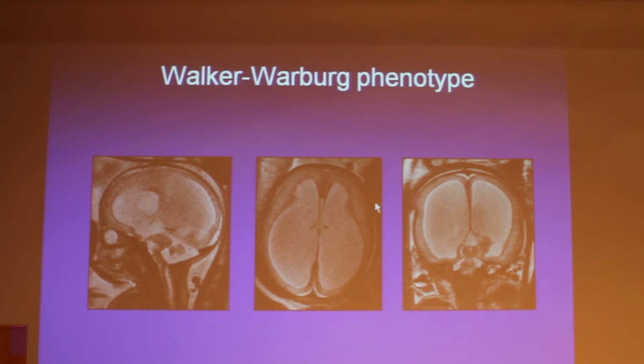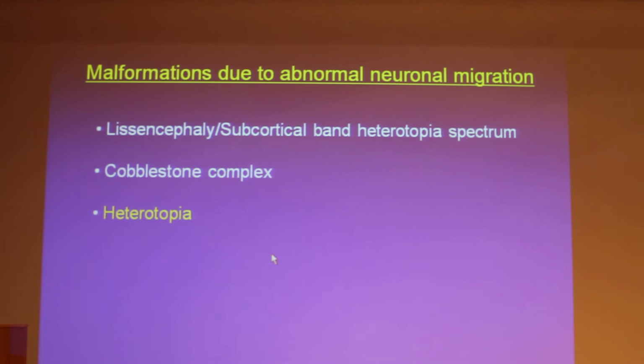This is a case, and it's actually the only case of Walker-Warburg phenotype at that time, and this is, again, like 7-8 years ago. Look how typical it looks with the abnormal brainstem. Look how typical it looks compared to the previous case, the cerebellar abnormality. And this case was followed, this is a very religious family. They thought it was only going to be hydrocephalus rather than any cortical abnormality. And the cortical abnormality was only identified later in gestation.